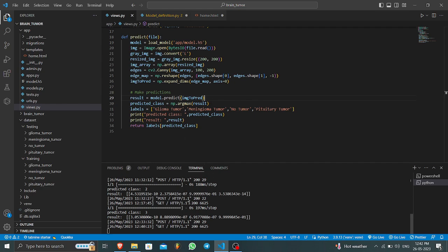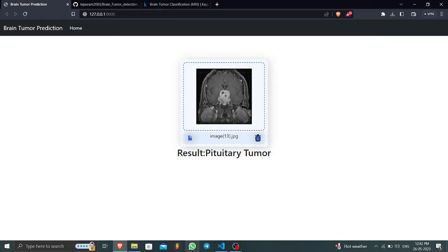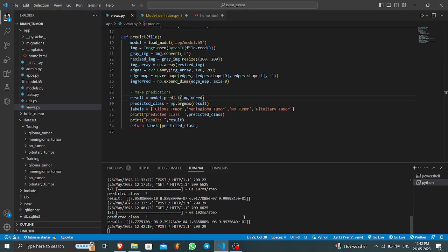As you can see, if I just gave an input here right now, after we get the result, the result alone would be a list. What this list basically provides is a number showing which value is more likely to occur. This is currently the highest value here, like 9.99 times 10 to the power of something, and that means this value is that much likelier to occur than the other ones. So we cannot just output this as our result to our users. That won't be really user friendly.